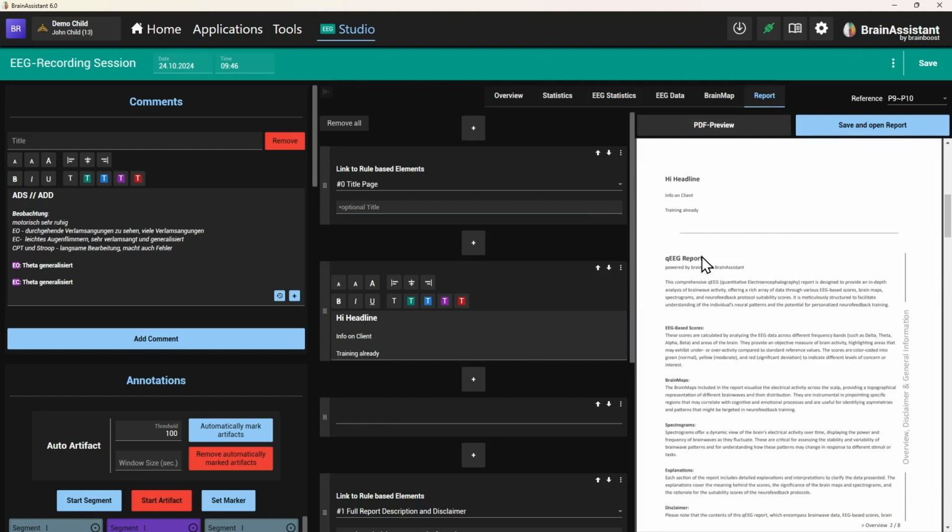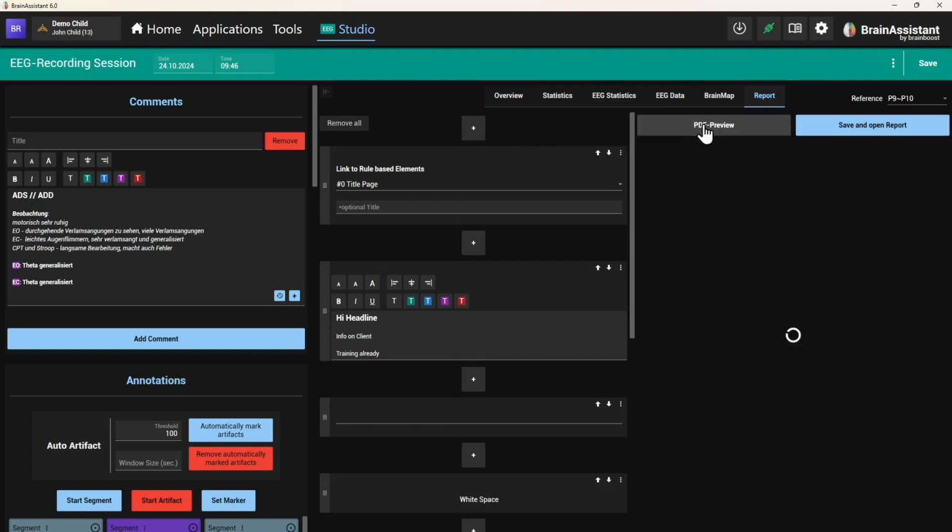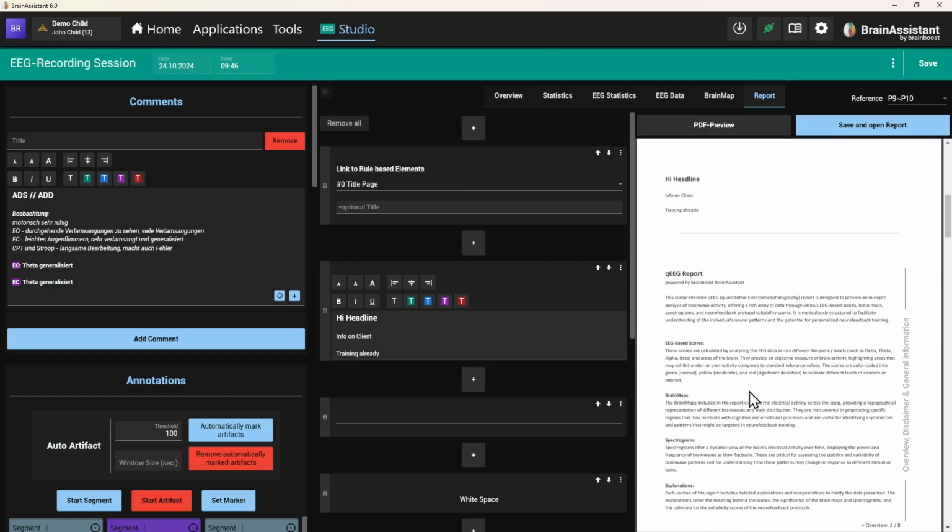So it's kind of a divider, basically. Let's check what else we got. So this doesn't look too pretty either. So let's check plus. We have white space. Okay, we can check this one out. So I'm not going to do everything with you. Oh, okay, so there's a little bit more space in between. Still, I kind of don't like this one. I want to keep this one just for myself, just as I mentioned in the slides.